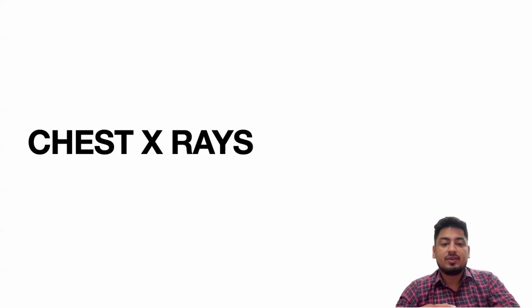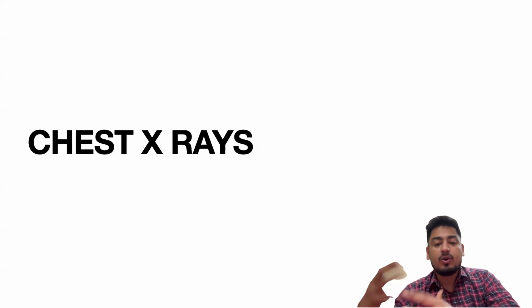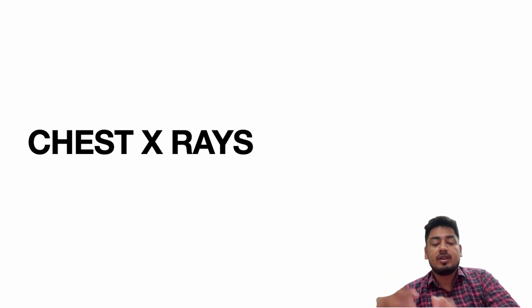Hello everyone. So today we'll discuss how to read an X-ray and how to approach the different findings in X-rays. X-rays are really important when you appear for your final year MBBS exams, your NEET PG as well as INICET exam, as one or two questions are definitely asked on X-rays, and when you appear for your MD final year exam.